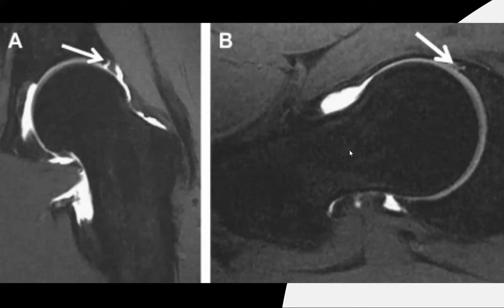What we see is a partial thickness labral tear. You can see the bright gadolinium extending into this little gap over here, which is a partial labral tear. We can see it again, it's irregular, it's not sharp like the posterior labrum. Look at this posterior labrum, it's this triangular shaped dark structure. Look at it anteriorly, it's got this intrinsic high signal in it, it's not particularly well defined. This is a labral tear unless proved otherwise.